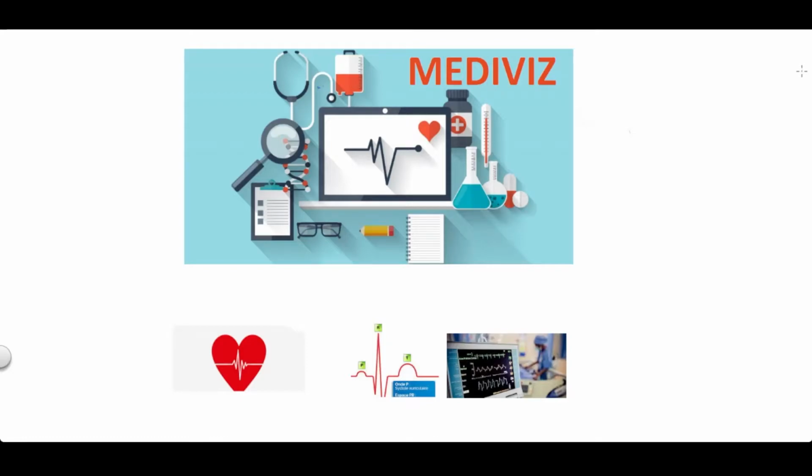What if I tell you, if you learn one skill, that will save many lives? Yes, if you know to interpret ECG, you can save many lives. So today's topic, we're gonna discuss about basics of ECG.